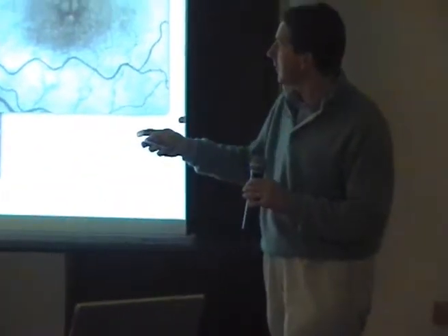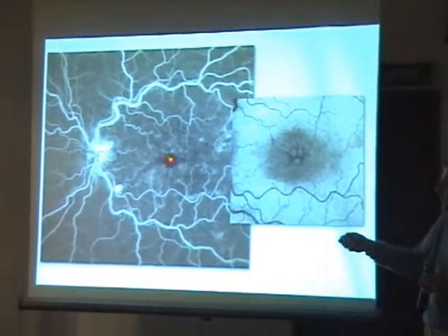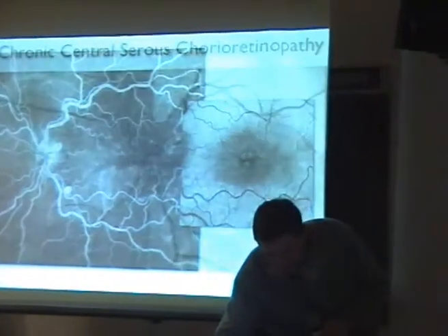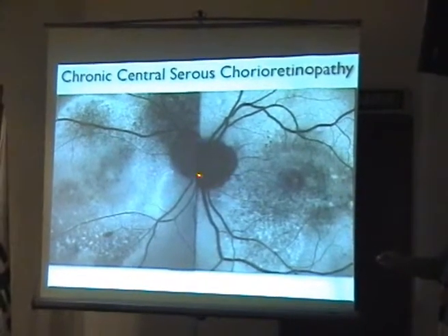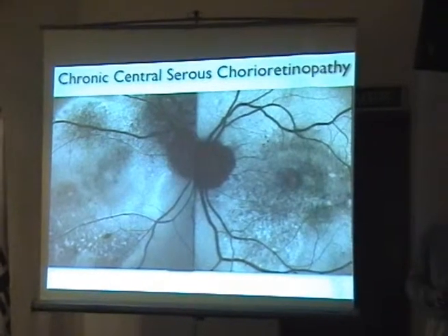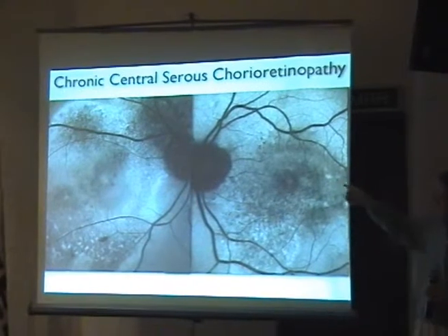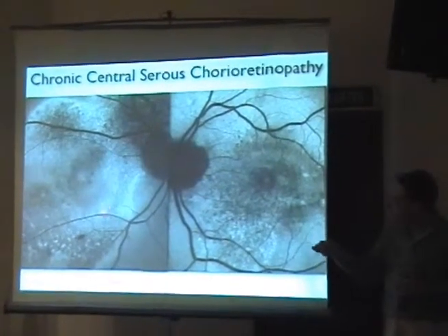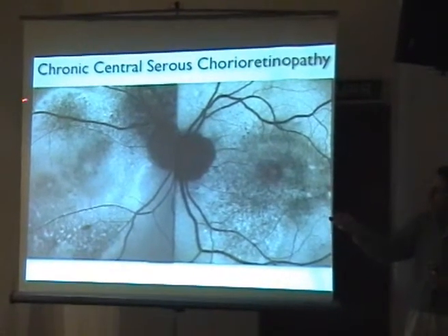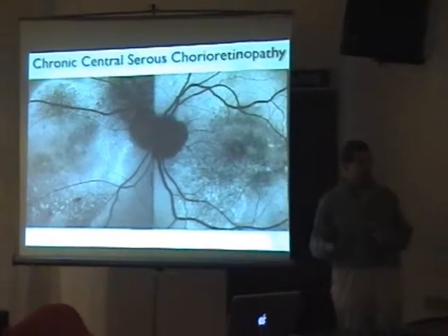And in fact, if we look at the fluorescein, you see probably better in autofluorescence than in the early phase of fluorescein. Chronic central serous chorioretinopathy. You see an increase of fluorescence here. Until this presentation was done for the first time, this was a real normal sign of central serous, but we couldn't answer.